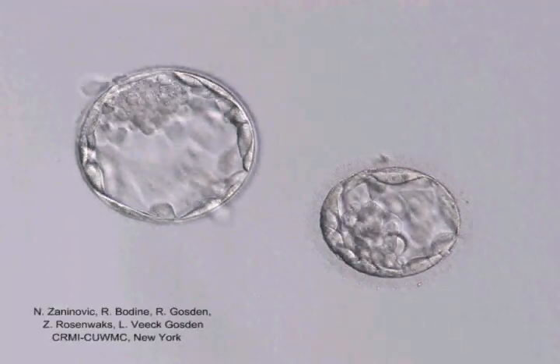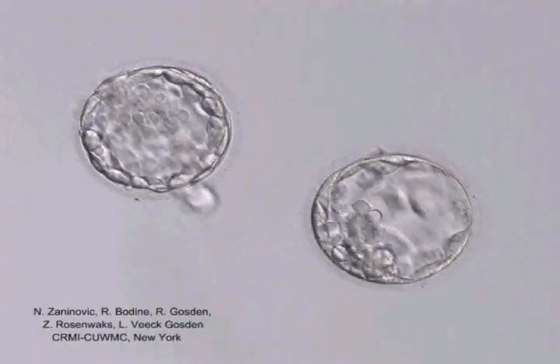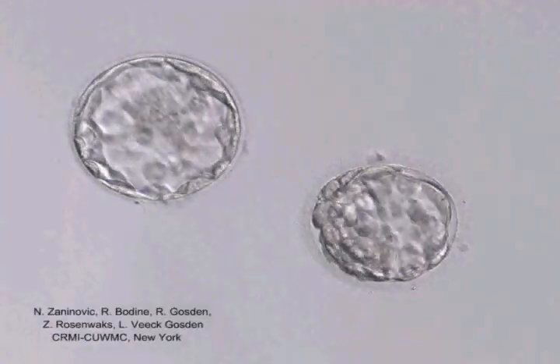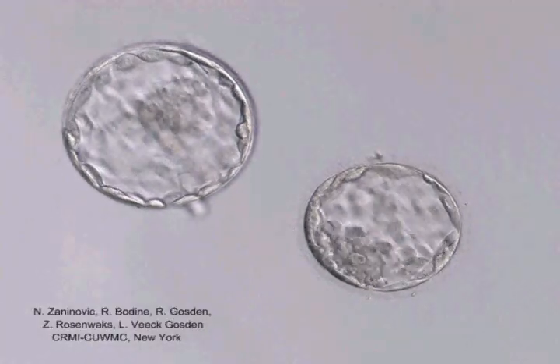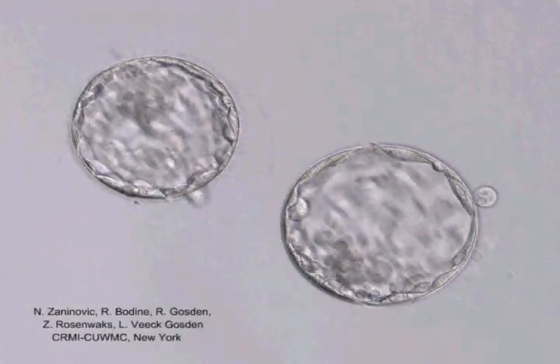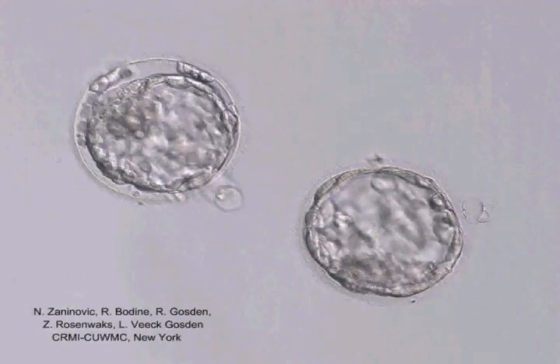The inner cell mass can be seen moving within the embryo and creating a clump of cells, the inner cell mass, at one pole. On day 5, the blastocele of the left embryo now expands rapidly, and the zona pellucida is stretched thin but never to the breaking point. It then rapidly collapses and re-expands. The left embryo undergoes 3 cycles of expansion before hatching on day 6.